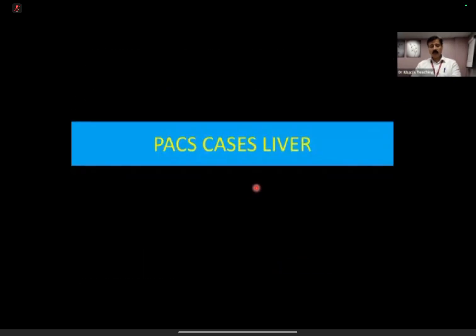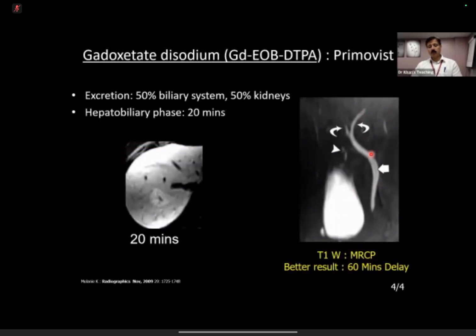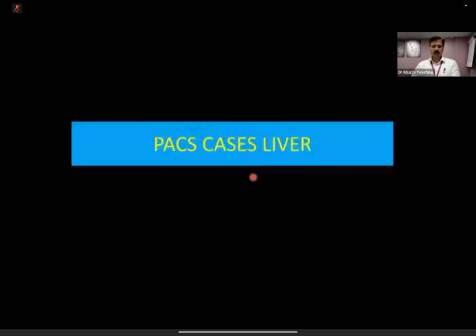So for this, what we do is that we do about a 60-minute delay. Instead of a 20-minute delay, we give it more time and it will excrete. I'll show you an example shortly. We've done about 12 or 13 cases, and only in 3 or 4 we were able to answer the question. In others, we were not, but if you delay it further, you might get better answers.